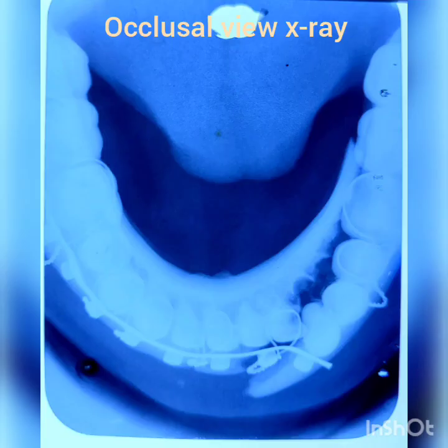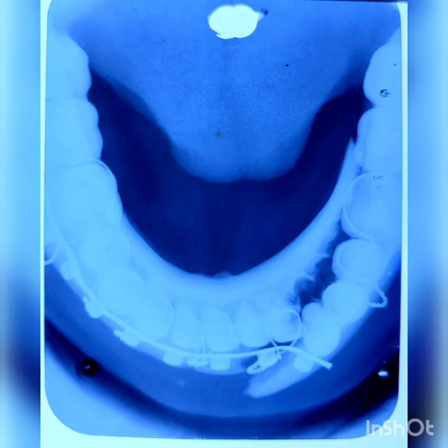Third example, it is intraoral x-ray, occlusal view of mandible showing a radiolucent irregular line between lateral incisor and canine extending to second molar lingually and up to central incisor buccally, separating alveolar bone from these teeth. It also shows arch bar and ivy loops fixed on teeth. Radiographically, it is a displaced compound fracture of mandible with some treatment going on.